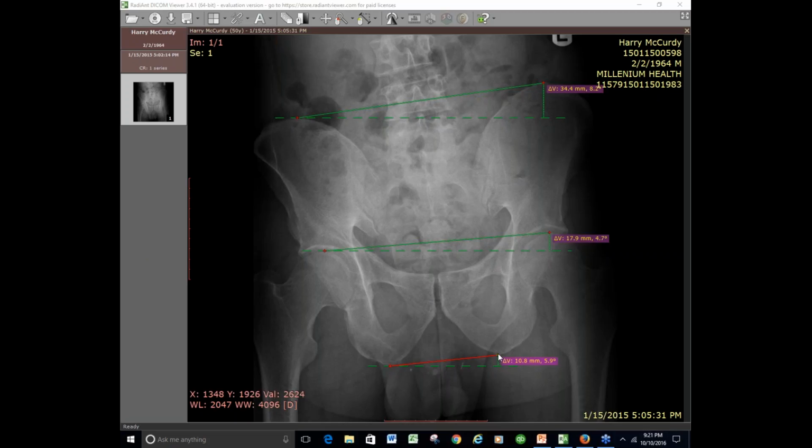Sure. So I'm going to take this ischium and I want to match that degree, right? So I'm going to bring it up. Sometimes it doesn't want to go exactly. Okay, I get the idea. We'll say 8.3. Okay. So now, if I understand you correctly, I am taking this 15.1 and I'm subtracting the 10.8 where it was before. Because we already had that 10.8 millimeters of difference, right? Yes. And I need 15.1 millimeters of difference.